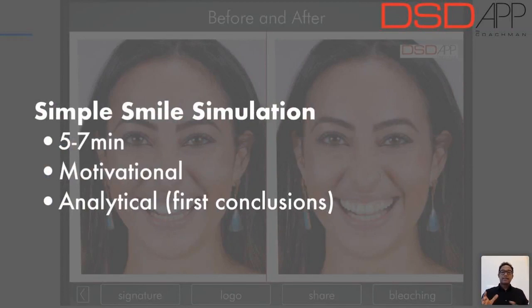The app has these amazing features and it does a lot for you. So what is the goal? The goal is to create a simple smile simulation within 5 to 7 minutes on your first consultation so you can get that wow factor to your patient.